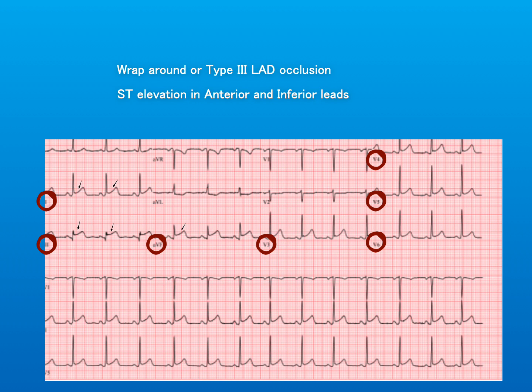When you have occlusion of this type of LAD, it can mean that you'll find concomitant ST elevation in both the anterior leads and also the inferior leads as well. And again, this is going to put a large amount of myocardium at risk.